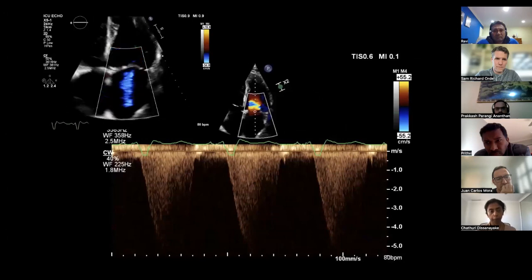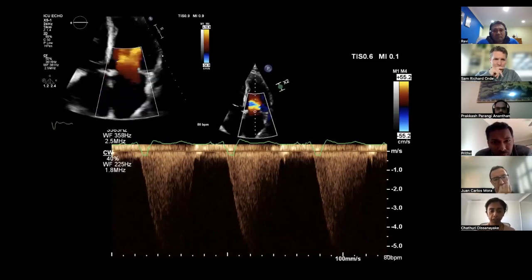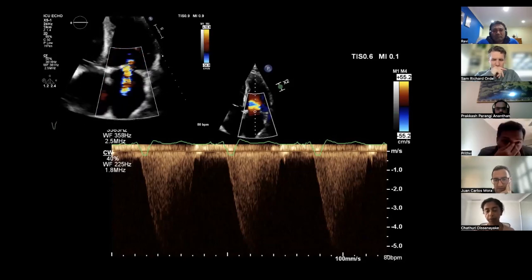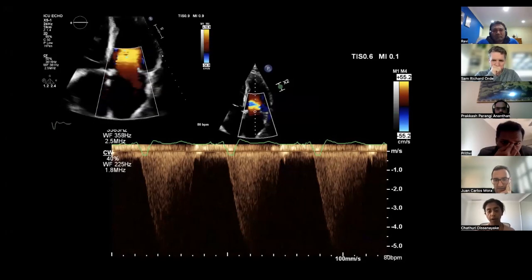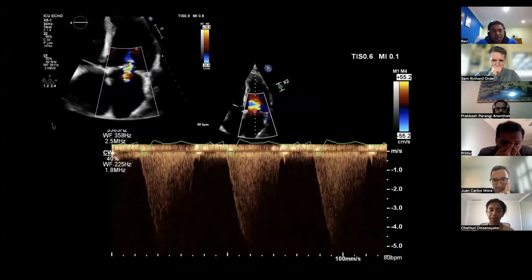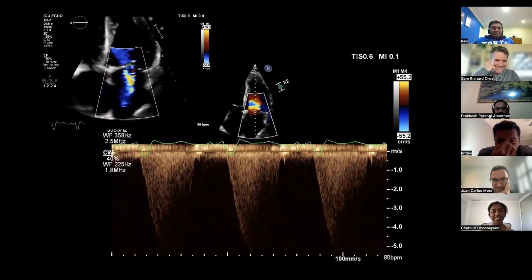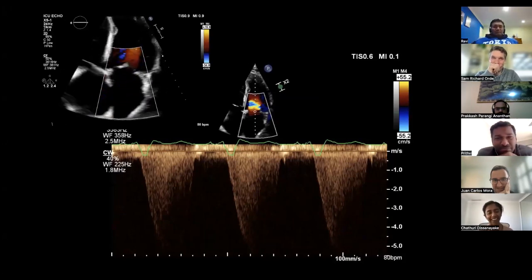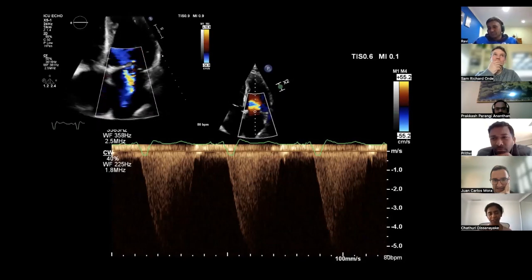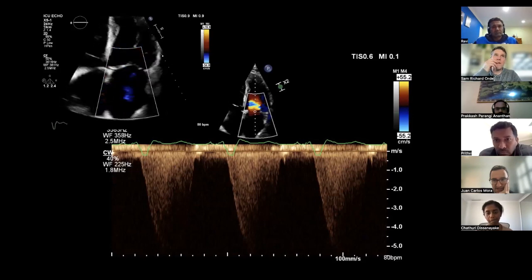So this is looking at the mitral regurg. There is mitral regurgitation. It's an incomplete envelope and not a dense Doppler profile. So I think this is probably mild to, I'm just going to pick one, moderate mitral regurgitation because of the degree of atrial enlargement. And I suspect the aortic stenosis is probably the bigger issue, as well as the impaired LV function. Doppler trace tell you anything else?